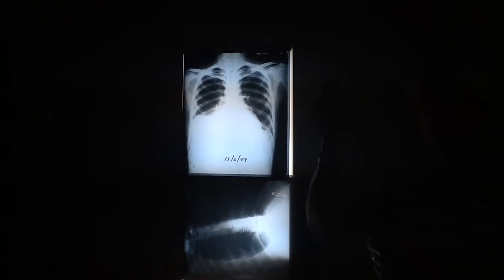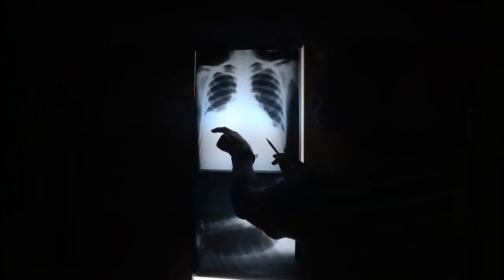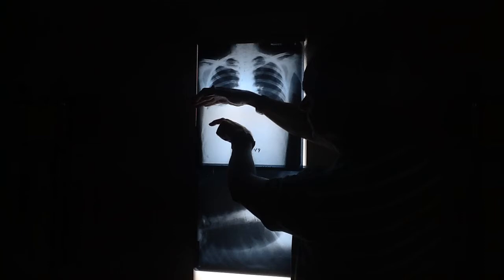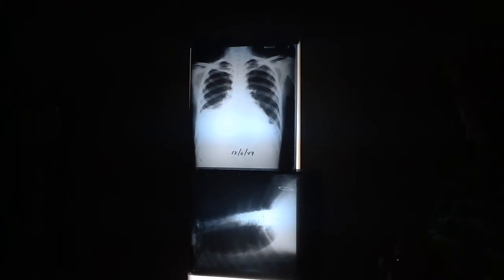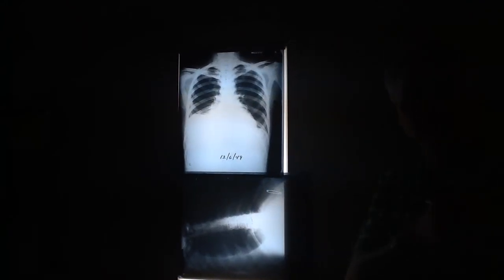The high point's usually at the midline, but it looks like it goes up and then goes down toward the midline. So somewhere down here is where the diaphragm is, and then here's the lung base, and this is all liquid. It's what we call an atypical pleural effusion. And we don't know why some people do that. Why do some people accumulate fluid with that kind of a pattern?